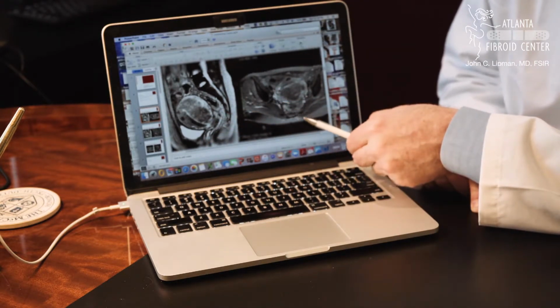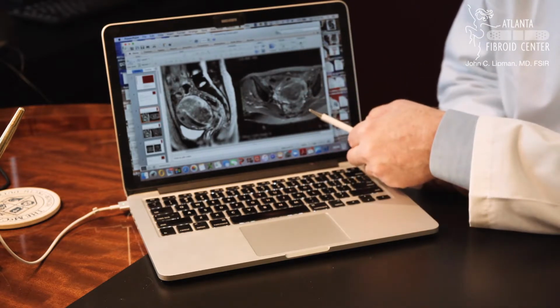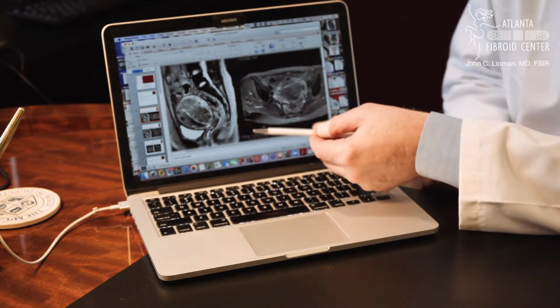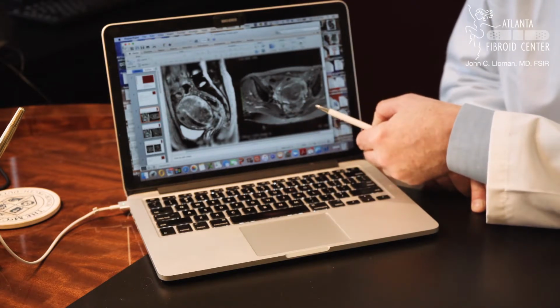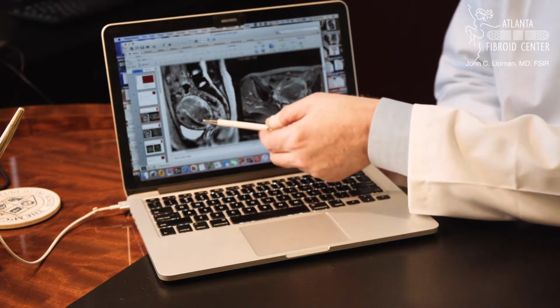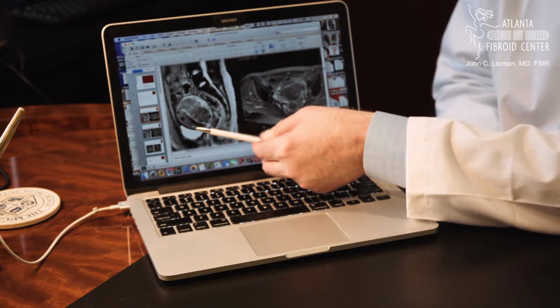And I'll next show you what happens after treatment when the patient undergoes embolization. Because with uterine artery embolization, it will treat both conditions. It will treat the fibroids as well as the adenomyosis. But if this were tackled surgically and the patient is under the impression her problem is fibroids, these cannot be removed surgically. The margins are not as sharp as for fibroids.